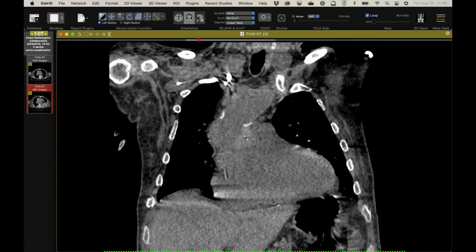I think that makes sense. I mean, we've seen a lot of times they form small kind of pseudo or contained, like it looks like a little pseudoaneurysm or contained collection, but I think that makes the most sense. Yeah. But you guys couldn't give contrast on this?